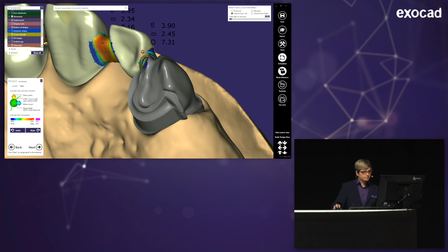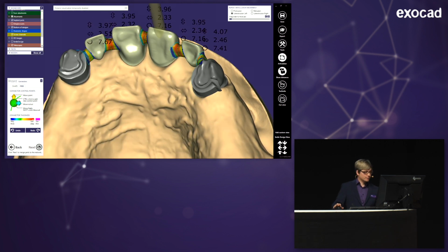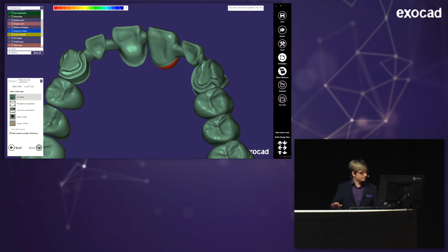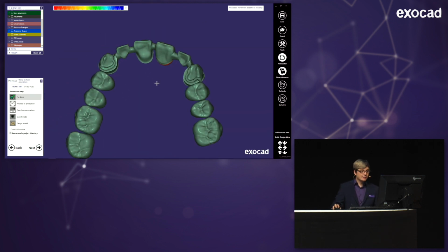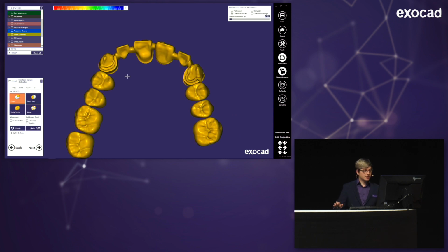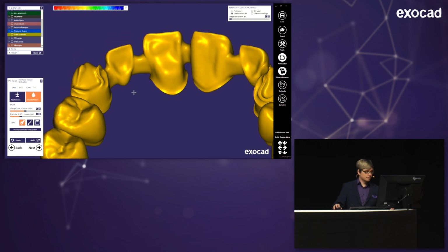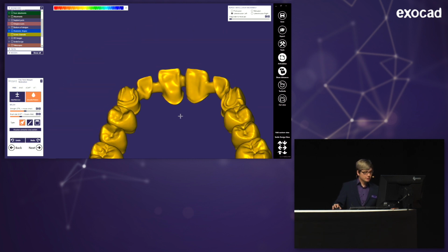Okay. So, and now this whole part gets merged. But I'm still, again, going to freeform the whole restorations, because if I freeform a merged restoration, actually none of the parts except the crown bottom is safe. So I can freeform on everything. I could actually just start smoothing the linguals if I wanted to. But why would I want to? But I could.